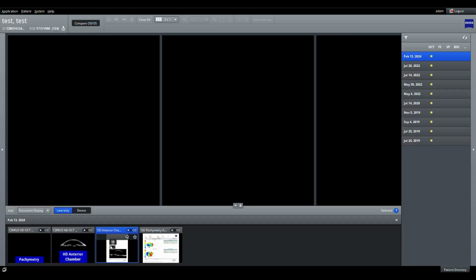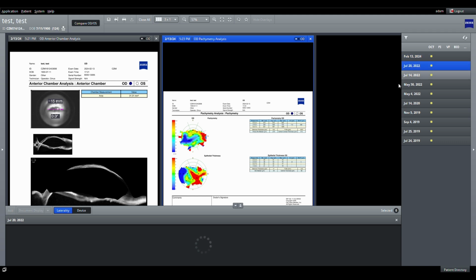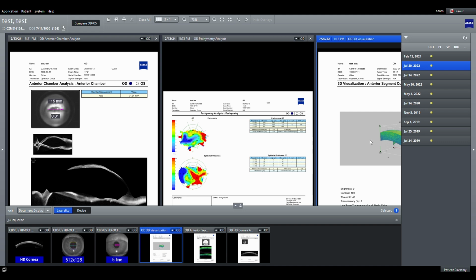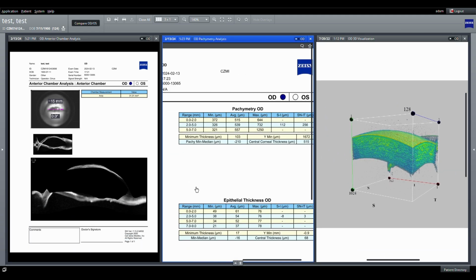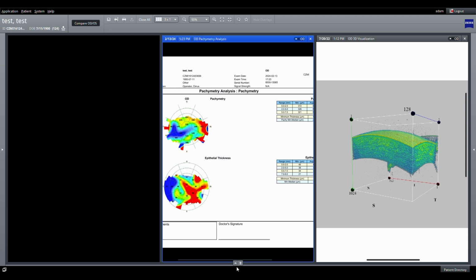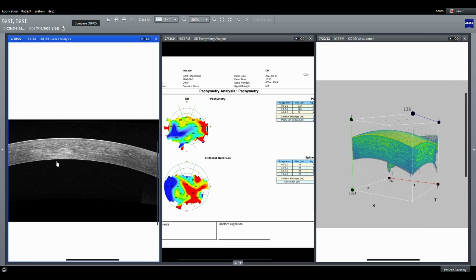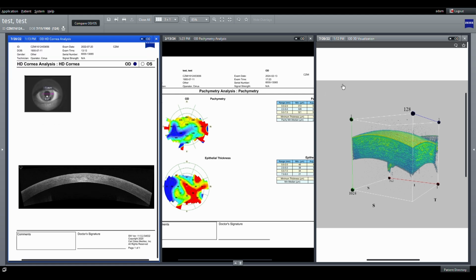For most applications, this approach is reasonable, it makes sense. The only problem is if you have rasters or 3D scans, because you only have the printout of a section. So it's not really ideal. For most cases, if you are happy with the printout, that's as far as you can get. But for, let's say, 3D, if you want to scroll the scan down, you still need to have the Cirrus viewer for that reason, or Retina Workspace or any other workspaces that you want to use.